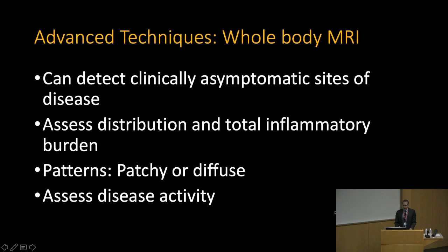So some more advanced techniques, and I have to thank Dr. Ardalan, I don't know if he's here in the audience, for pushing us to try to do more whole body MRI for JDM. We've had a few cases where we've been able to do this at Lurie. It requires imaging at multiple stations, and then you have to have stitching software, which can stitch it together to show the pictures that I'll show here. Produces very cool pictures.